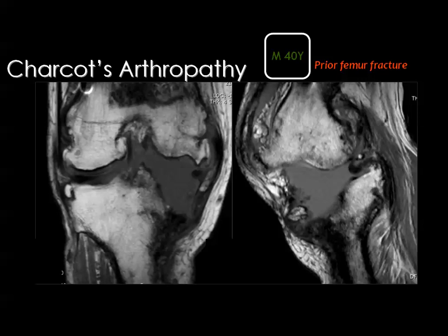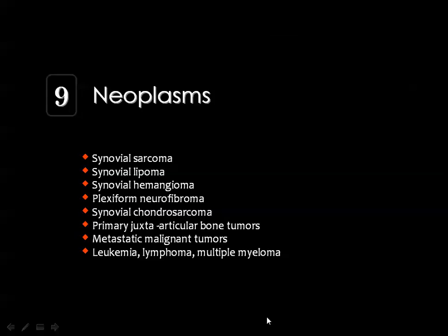If you use MRI, I think you will not add too much to the findings of the plain X-ray. You may be able to see more extensive destructive changes and more bony fragmentations. And in between these, you may see some fluids or inflammatory granulation tissue.